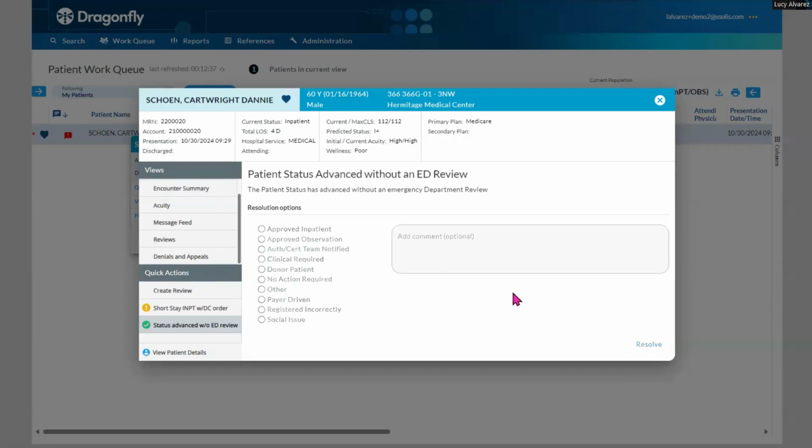Once you wait a few seconds here, that yellow exclamation point turns into a green check mark. The notifications will not fully disappear, but they will turn green. And then once you resolve them, that little red dot next to your population is going to disappear.